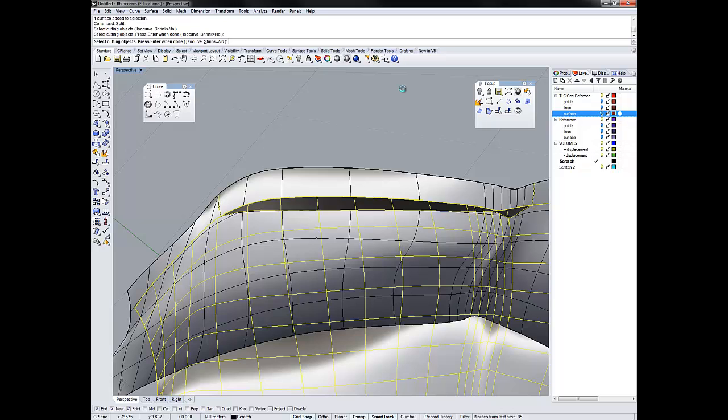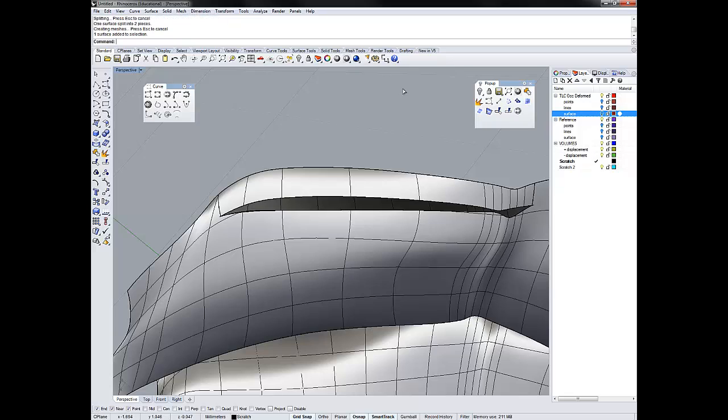And then I'm going to hit right click, and it says one surface split into two pieces. And indeed, if I select this, I can see that that's correct. So why don't we start by making this small volume first. I've selected both of them. I'm going to make it easier for us to look at what we're actually talking about here.